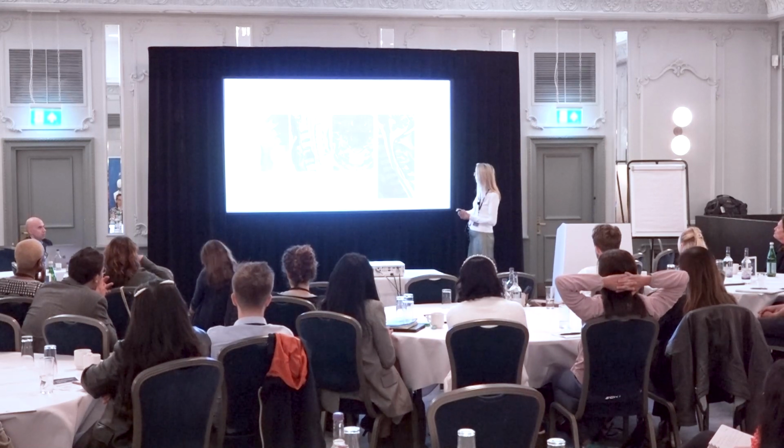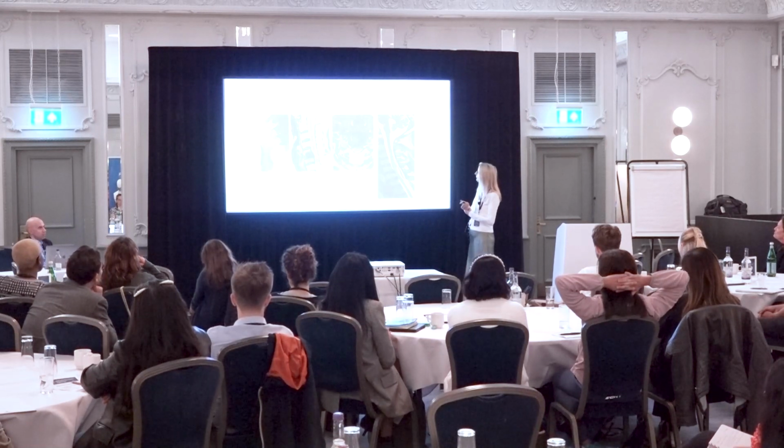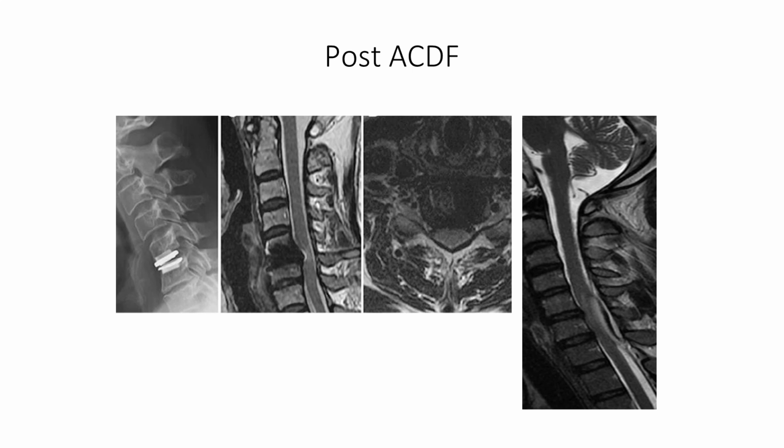And just a few terms about post-surgery. The most common surgery that we see in the cervical region is an anterior cervical decompression and fusion, and there are different techniques that Rafid and his colleagues will use, but the common things: you get a disc spacer, or you get a disc replacement, or different types of disc replacements. They all look a little bit different on imaging, but the general approach is the same.